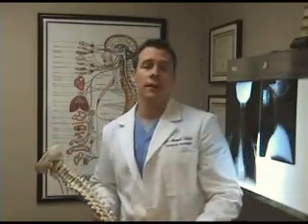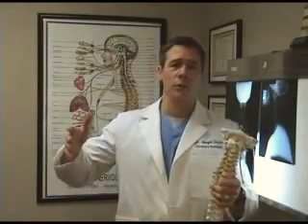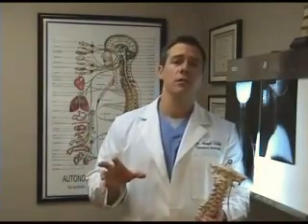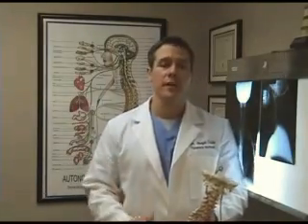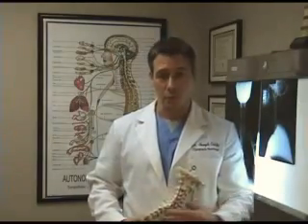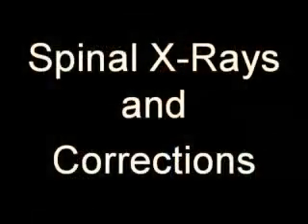So what I'm going to do right now is have you sit down and relax. We're going to zoom into a TV where you can actually see these x-rays nice and close up, and I'm going to go over all the different x-rays that we took, and I'm going to show you some examples of corrections, pre and post corrections of patients that just started care and patients that went through a corrective care program and were able to improve the structure of their spine.